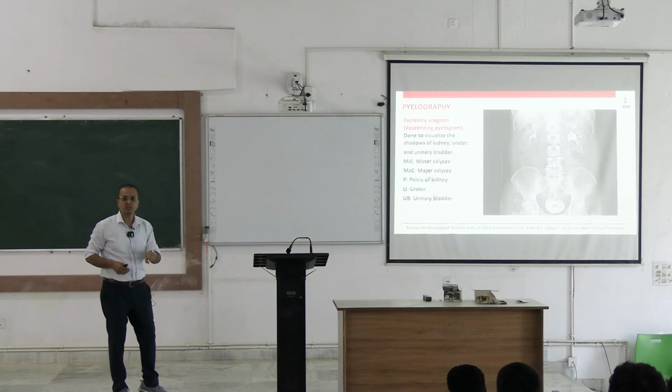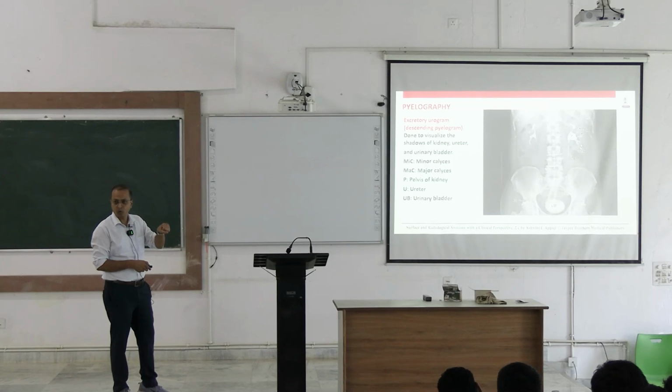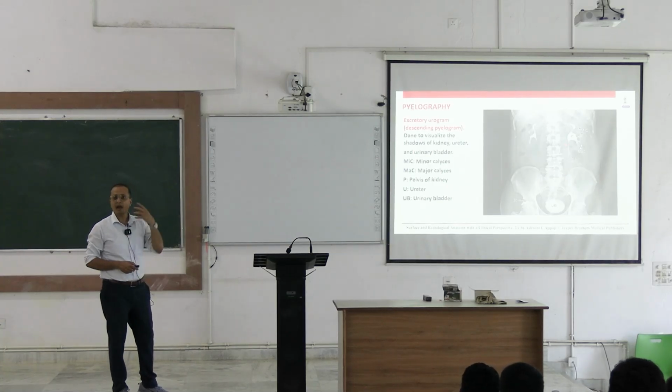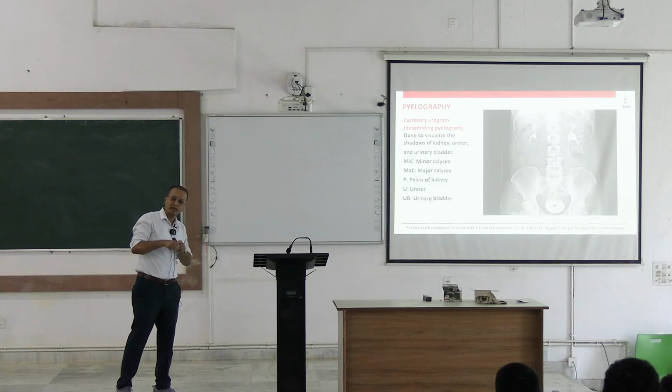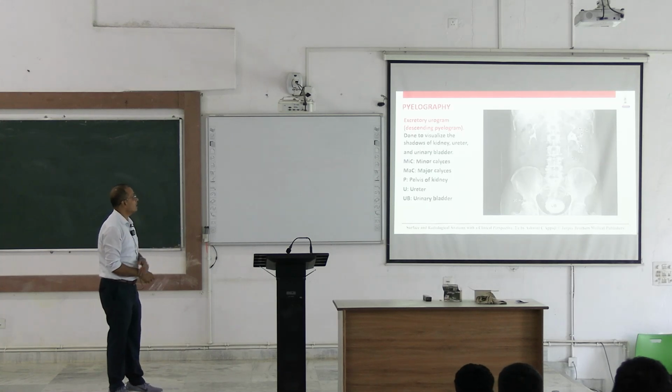So, when the peristaltic contraction is there, the dye is not visible at that point because that part is in contraction mode, whereas the other part which is dilated is showing. So this part is not visible, this part is visible, then not visible, again visible. It is not an error of the ureter system, it is because peristalsis is going on. When this part is contracting, the dye cannot be seen because the lumen is closed and it is pushing the urine down. Then the part which is relaxed and receiving the urine is visible. So this is how it appears.